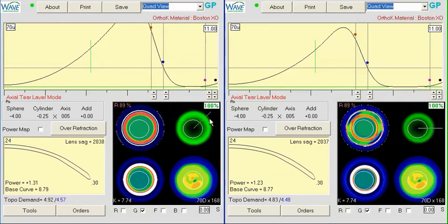And I'm going to spin around and tidy up the individual meridians so that they're a little bit more uniform. Okay, so that's pretty close to the 1.23 that we started with. And if we see where the line crosses, we're at maybe 3.1 millimeters.